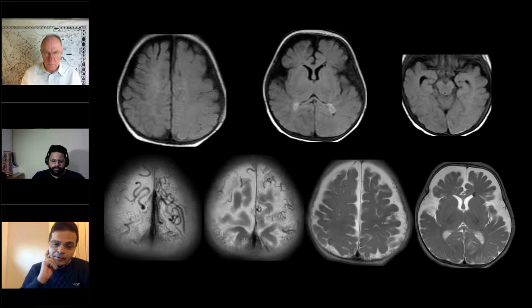According to the neurologist here, I've asked them what exactly they mean by neuroprotection, and they said aspirin. But of course, if they have seizures, then you might want to control those seizures. And you can see on the T2 here, which Nihal is showing below, there's already hypermyelination, accelerated myelination, happening on the left compared to the right. So the axonal degeneration from the profuse seizures has led to this atrophy that we are picking up as well. So perhaps early intervention would be key in many of these cases.